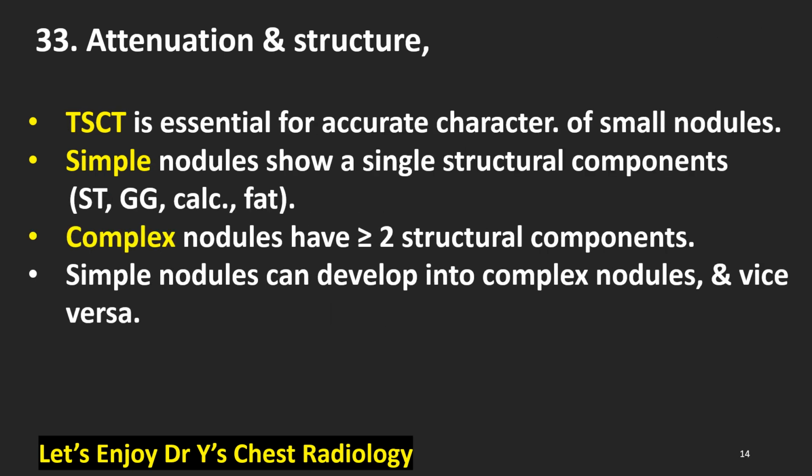Attenuation and structure of the nodules. Thin section CT is essential, not thick section CT, for accurate characterization of small nodules. Simple nodules show a single structural component such as soft tissue, ground glass, calcification, or fat density. Complex nodules have two or more structural components. Simple nodules can develop into complex nodules and vice versa.